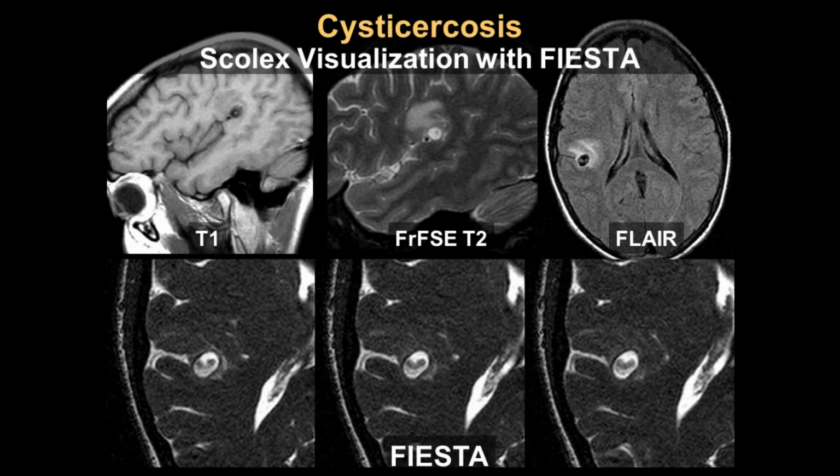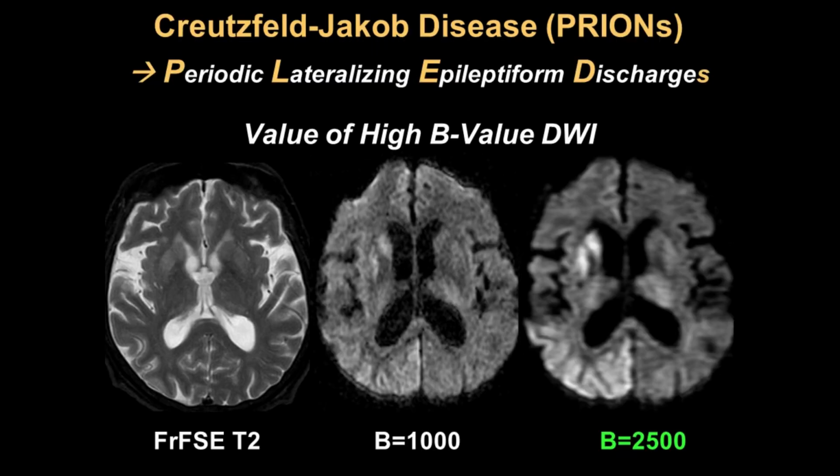Now, everywhere in the world, and I'm sure also in your country, we have parasites, and in particular, cysticercosis is an extremely common cause of new seizures and epilepsy. Cysticercosis was found in this graduate student who'd been traveling to Mexico, who was a UW-Madison student. And with new seizures, we conducted a screening MR, saw this slightly complex cystic lesion with a little guest inside and some surrounding vasogenic edema. On high-resolution FIESTA or CISS type imaging, we can actually see the scolex here. So an easy diagnosis to make.